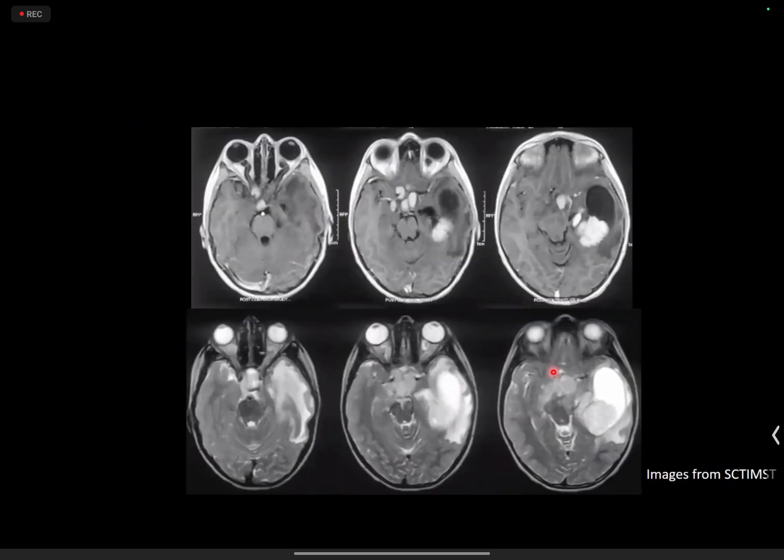Okay, here is an adult lady with NF1, and we are seeing scans over time. I'm sorry, I did show the answer, but please describe the findings.